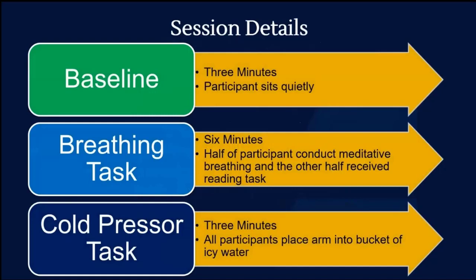Okay, so just to get started, before we actually start looking at the MindWare HRV application and the ECG data, I want to describe this experiment that we're going to be covering today, and then it'll make a little bit more sense when we're looking at the data. The first thing that's going to occur in this study is we're going to look at a baseline. So, we're going to bring the participants in, consent forms, all of those things that we're used to, and let them habituate to the area a little bit, see the equipment settle down a little bit, then we're going to go ahead and start our baseline.